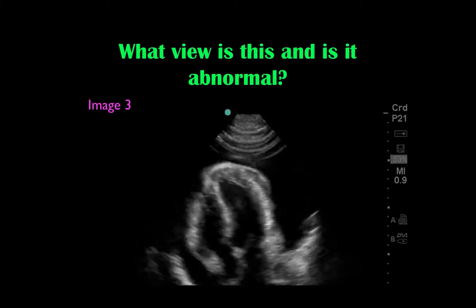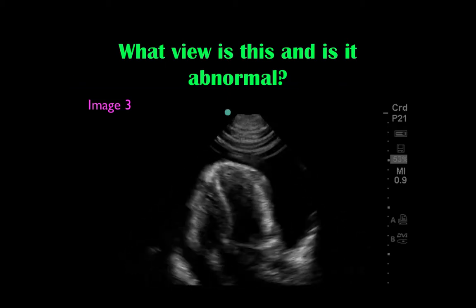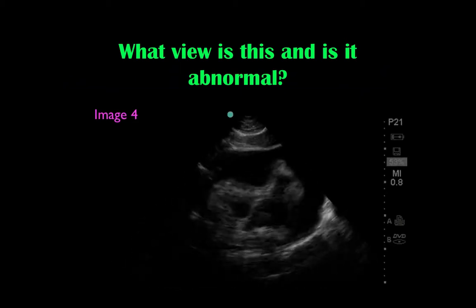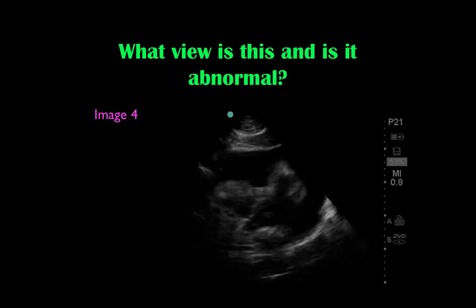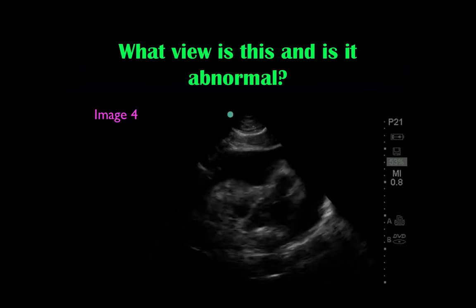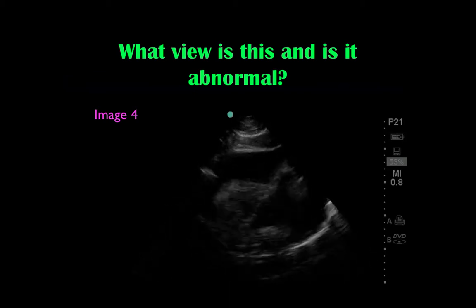And then one last time, we'll take yet a closer look at the heart for a more detailed examination with one more view. Image number 4. And the same question. What view is it? And then, of course, that's followed by the second question, any abnormality?